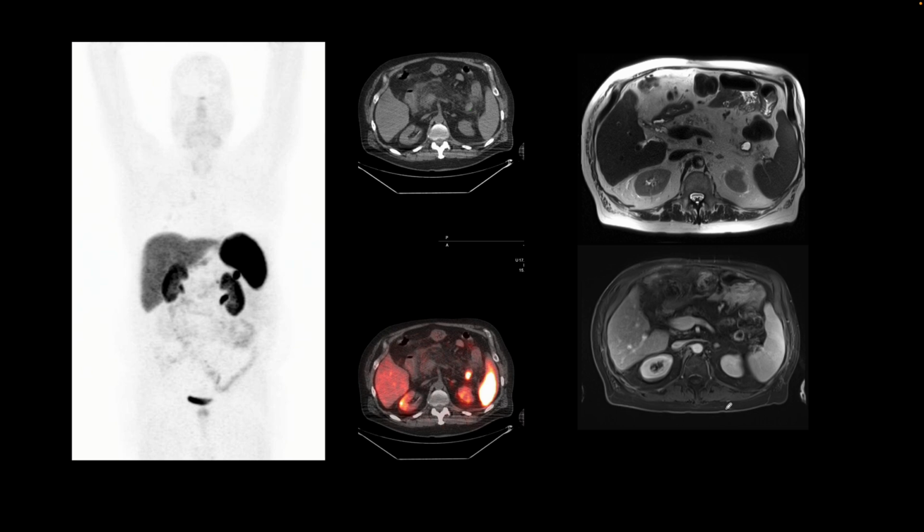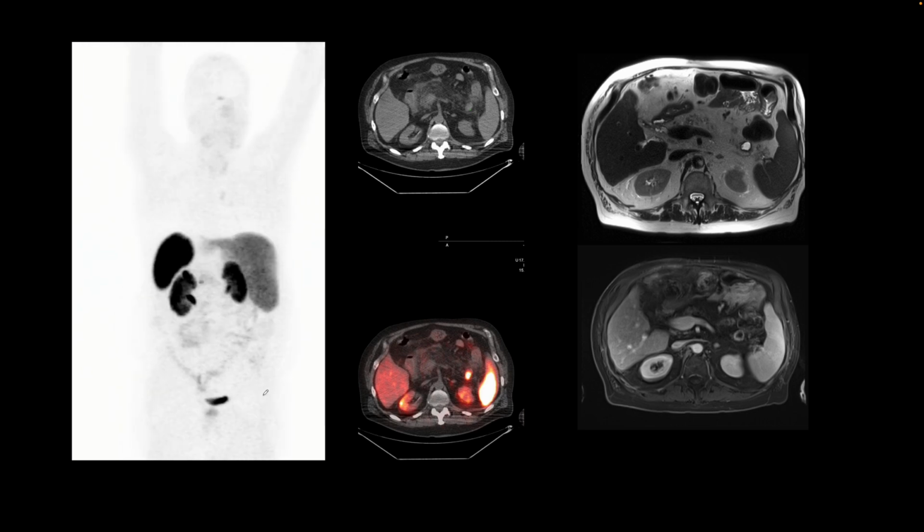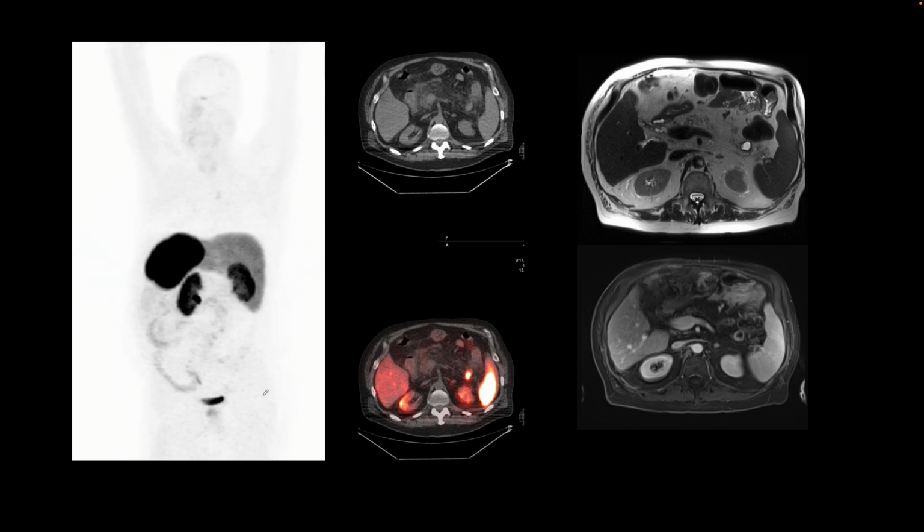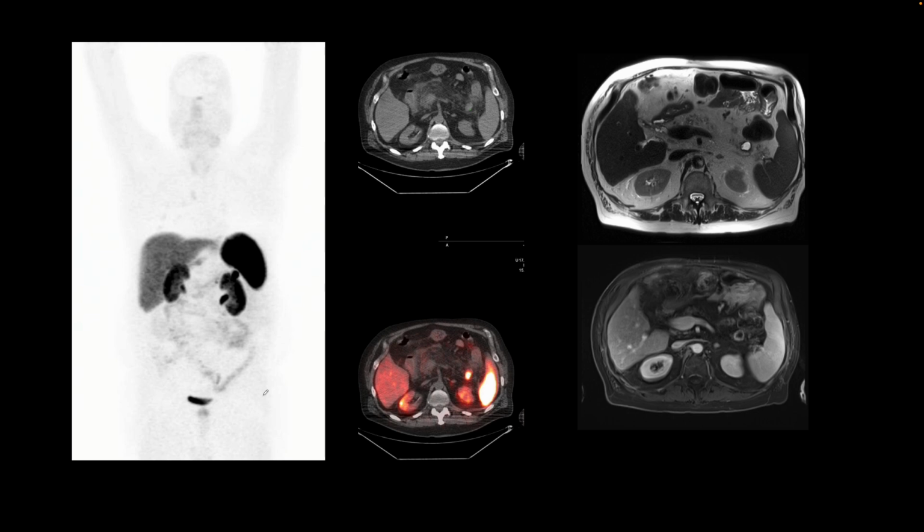This is our next patient. Very interesting. The dotatate PET CT is from 2 years ago when this patient was diagnosed with a pancreatic neuroendocrine tumor in the tail of the pancreas. Let's start by taking a look at this rotating image. Here we see physiologic distribution of the tracer with focal uptake in the pituitary, uptake in the spleen more intense than the liver, excretion from the kidneys into the urinary bladder, faint physiologic bowel activity, and this focus right here is their neuroendocrine tumor. This is seen right here, a solid tumor in the tail of the pancreas showing focal intense uptake of gallium-labeled dotatate.